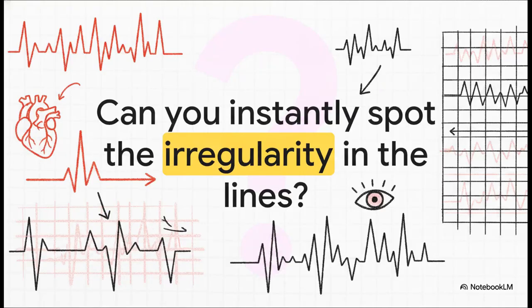We've covered tremendous ground today. Having trained your eye to jump from a simple, isolated red schematic all the way to analyzing sub-millimeter technical measurements on dense clinical grids, you now possess an incredibly powerful analytical toolkit. The structural chaos of this rhythm leaves a very specific footprint, whether that's massive, jagged squiggles or an almost imperceptibly flat line between uneven spikes. So I'll leave you with this final thought.